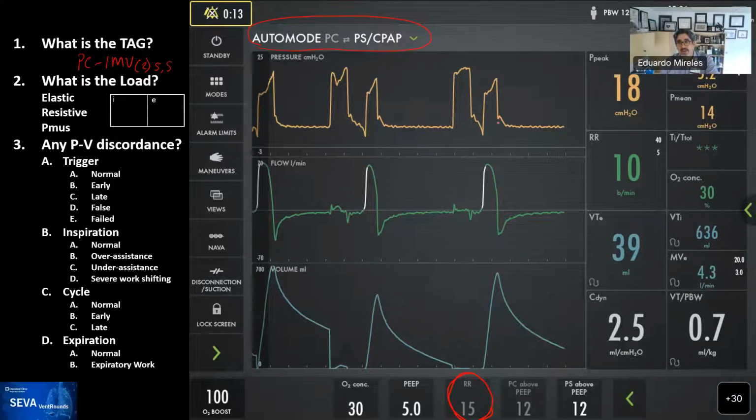And that just means that when there are enough spontaneous breaths, the mandatory breaths are suppressed, and so we continue to see the same pattern as we saw on the other one, in which the mandatory breath is not delivered, followed by the spontaneous breath, but now with smaller tidal volumes, but there still continues to be mandatory breath. So can you talk about what your research showed on here, Ari, please?